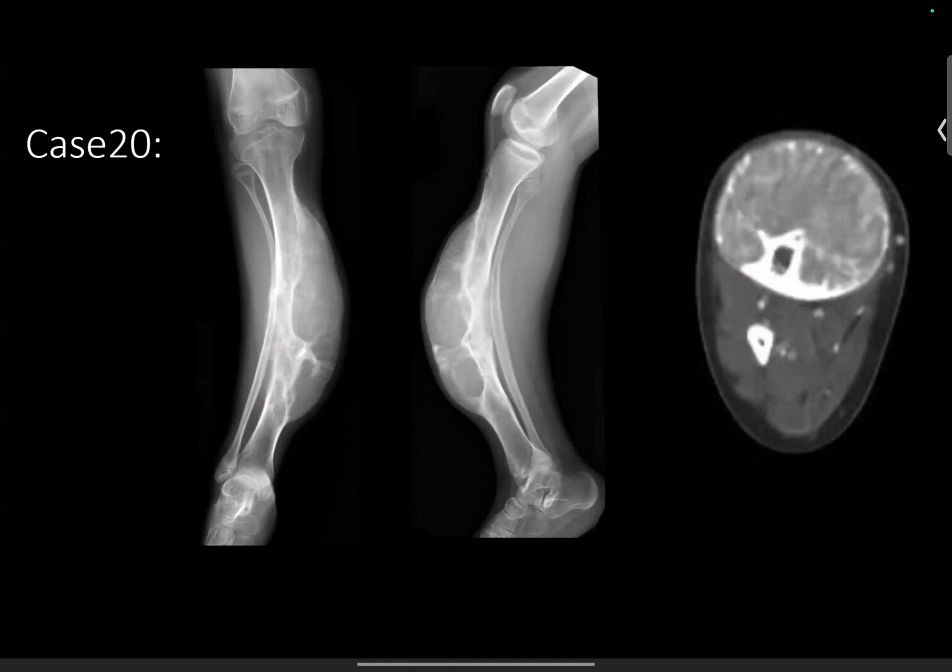And this was the largest osteofibrous dysplasia I had ever seen. Adamantinoma is a differential diagnosis, as was said in here as well. Usually seen in older patients, but definitely a reasonable differential. This was osteofibrous dysplasia. It loves the anterior tibial cortex. And instead of it being in the medullary space, it's in the cortex.